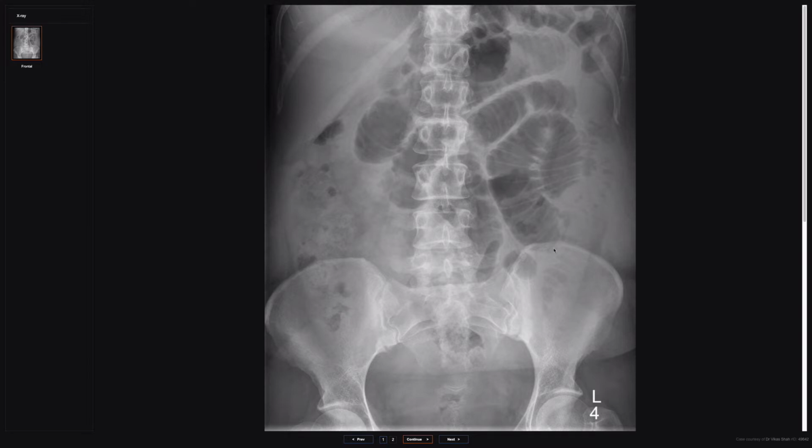And when small bowel loops are distended and obstructed on an abdominal x-ray, it's much easier to appreciate the gas that's filling them than fluid. Now, we don't do erect abdominal x-rays in this country, but if you look at textbooks, if you watch online videos, you'll see other people describing them, and then you'll end up seeing air fluid levels because the small bowel is distended with air and fluid.